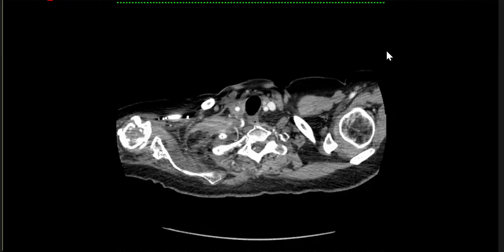And with such a history, that would probably be a metastatic deposit, which has caused affection of that right phrenic nerve with diaphragmatic paralysis. Which nerve roots make up the phrenic nerve? I think C4 and 5. I'm not really sure. I'm just trying to take a guess, which is not right. I know in the exam setting, but thank you. Thank you, sir.